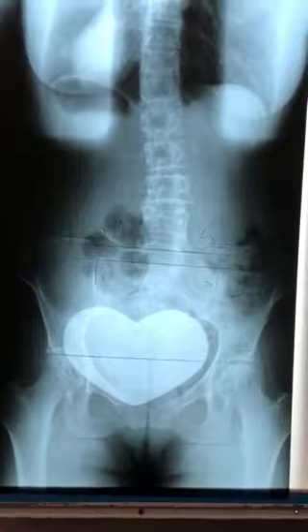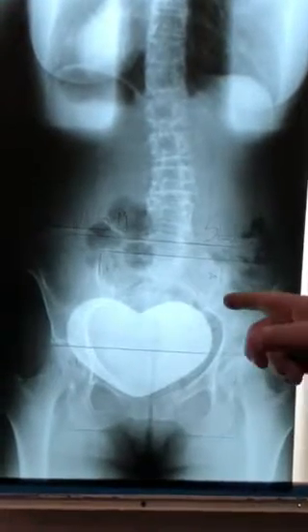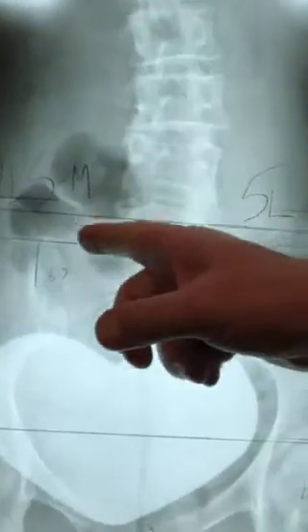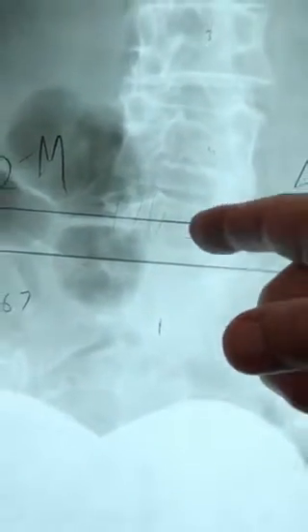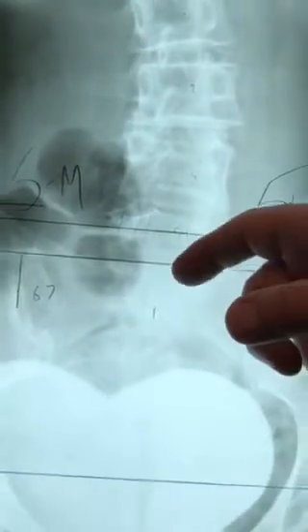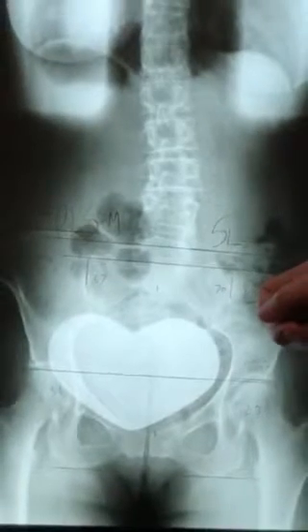Second question we're going to ask you is, what side of the ilium would you list, the right ilium or the left ilium? And the answer will depend on the lowest lumbar vertebra. This patient has 5 lumbars. Not all people do, but in this one they do. You can see the spinous processes are all to the left, which means the pedicle shadow is wider on the right. The right side is body rotation. We'll list the ilium on the side of lowest lumbar body rotation, so therefore we'll list the right ilium.